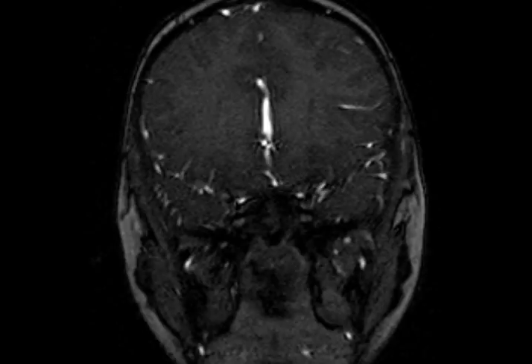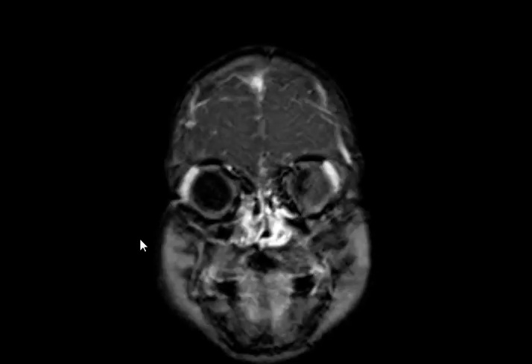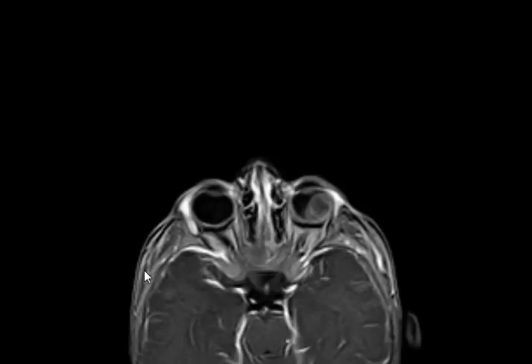Maybe we see something a little bit more, because you know under sedation it's not that easy to image a child. Here, the same thing. It's mild enhancement, nothing significant. What about, let's see, this one here? This is even better. Focused on the orbits. Here, it shows some enhancement. Okay? Not delay, it's just the first two sequences the child moved, so they repeated the image after increasing his sedation.